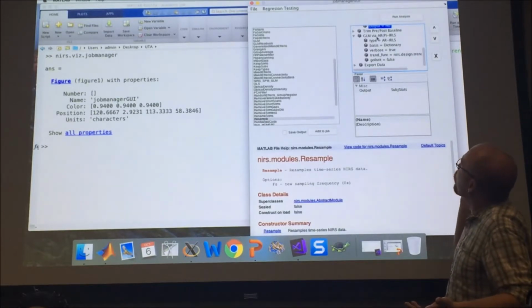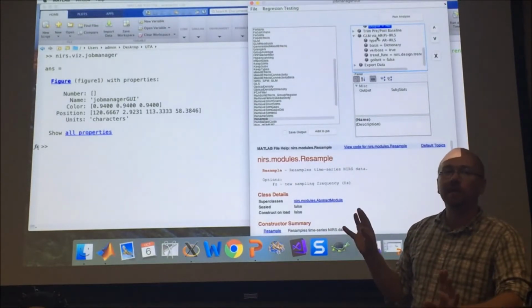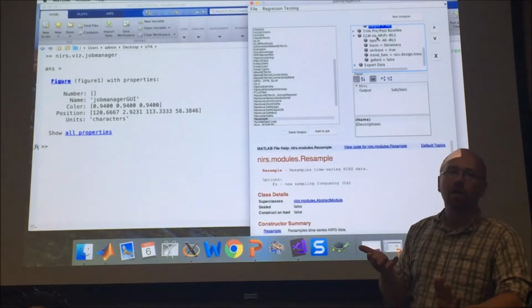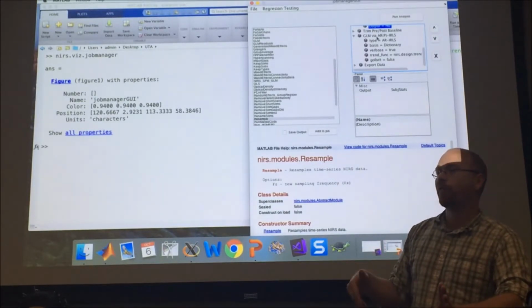The last one, the go for it flag, we're not going to have to use in our case, but if your experiment was not designed properly, such that maybe your stimuli were overlapping too much and you didn't have enough jitter and so on, this can create problems when we try to solve the math.